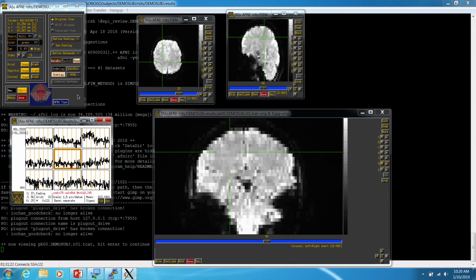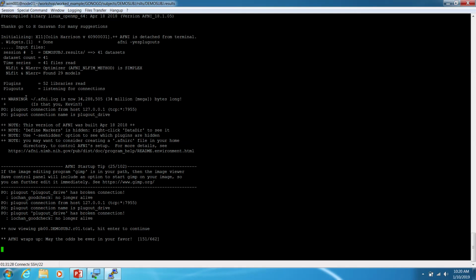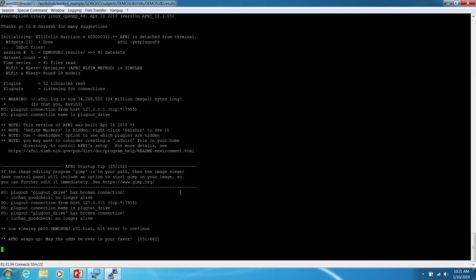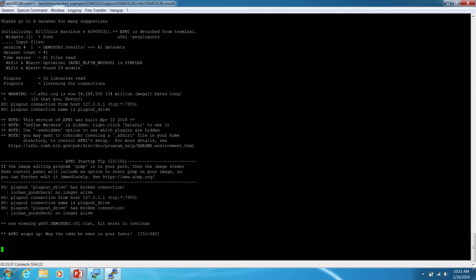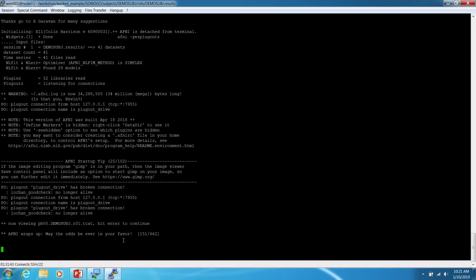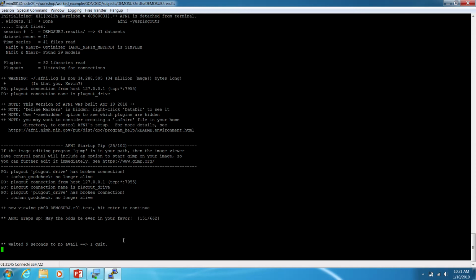So what I'm going to do is, this will take a second to load, but I want to show you, because I know there was a motion spike in there. This will probably take a second. Oh, I messed it up. Okay.